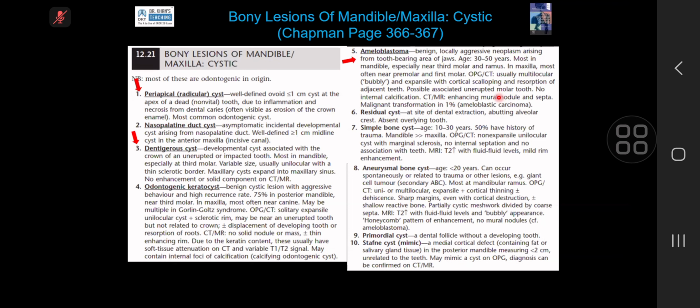always ask for a regular soft tissue window. Many departments make a mistake. When they send paranasal sinus CTs on PACS, they just send the bone algorithm, high resolution window. These are very good for paranasal sinuses, but you will miss that. So in usual practice, you must ask for a short soft tissue window. In our case, actually, there was nothing on the soft tissue window.